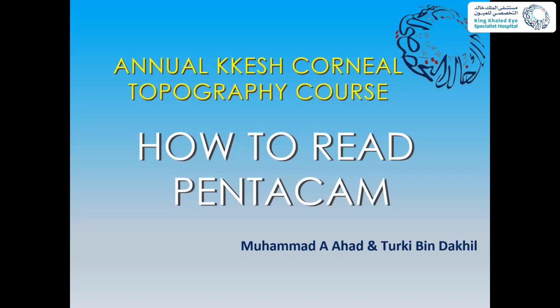So as the title suggests, this is about how to read a Pentacam. The aim of this course is just to clear the concepts and for you to understand that these are mere numbers. You don't need to know the numbers exactly because numbers come from different studies.